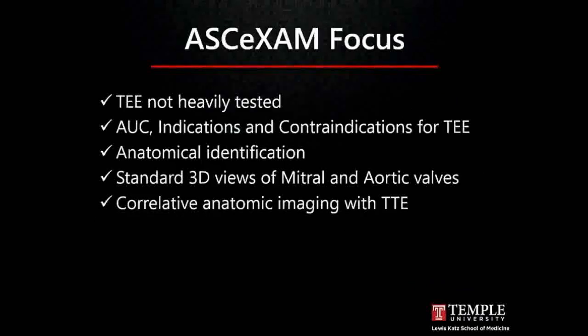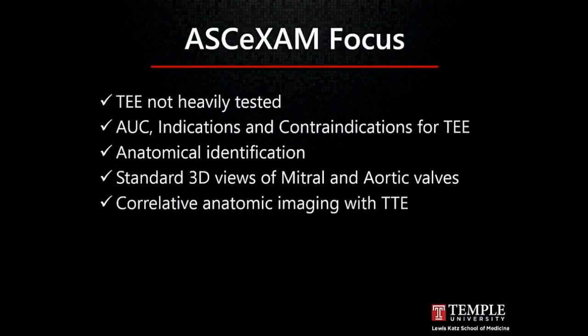But TE is not heavily tested. I'm not going to spend a lot of time on it. But what is tested is the appropriate use, the indications and the contraindications for performing a TE as they're outlined in the guidelines, anatomical definition or identification as they relate to cardiac structures on TE, standard 3D views of mitral and aortic. This is really the standard now. And then correlative anatomic imaging with transthoracics, so identifying cardiac structures.